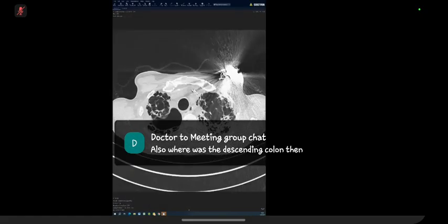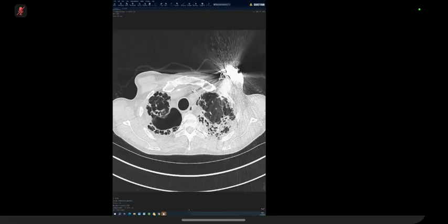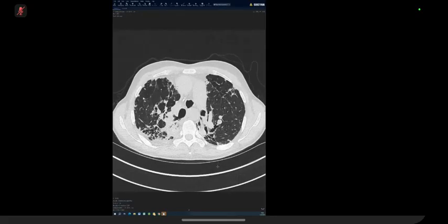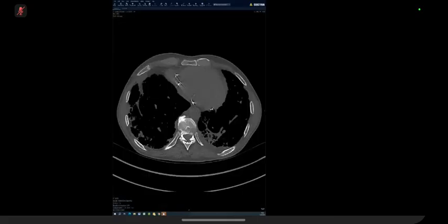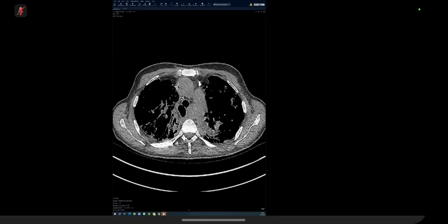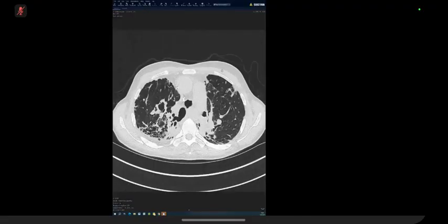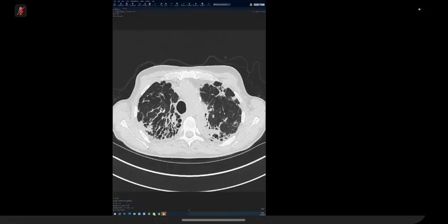So you have a pattern of fibrosis that's quite typical for a disease. This is a posterior pulling of the bronchi. It's almost like somebody standing behind the patient and pulling the lung backwards. It's very typical for stage 4 sarcoidosis. And by stage 4, lymphadenopathy has usually resolved and you have a bit of calcification left. But the pattern of fibrosis, the posterior one, is quite typical for sarcoid.